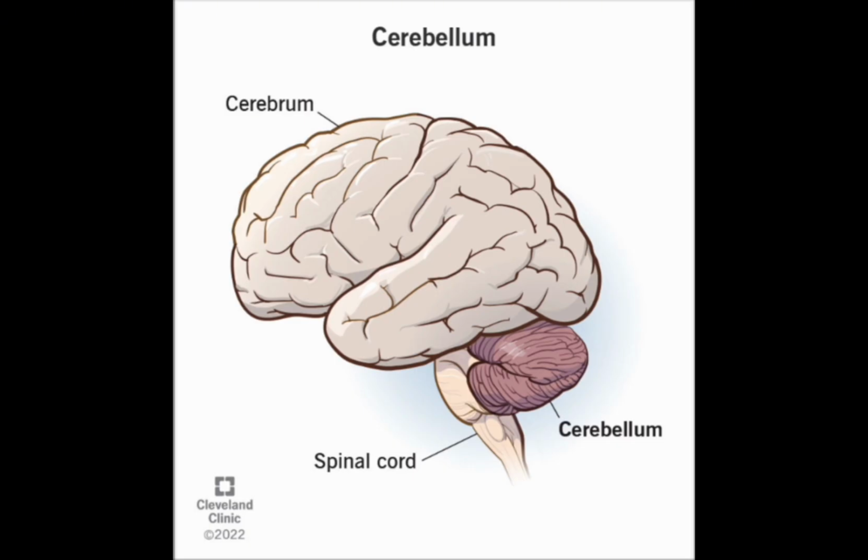It's divided into two hemispheres and connected to the brain through three pairs of peduncles. The cerebellum plays key roles in balance, coordination, and fine motor control. In this episode, we'll learn how to segment the cerebellum in 3D Slicer as part of our brain segmentation series.